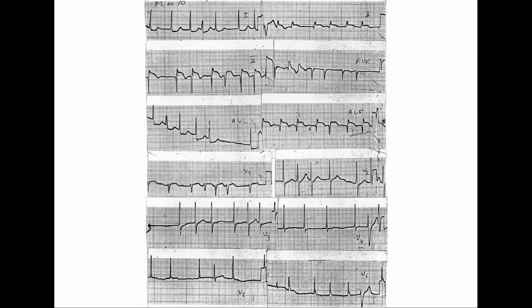Next is the QRS. Is it narrow or wide? They look narrow. Okay, very good. What about the axis? You can come here because we are in the QRS complex. It's maybe difficult to see, but this is lead 1, 2, 3, aVR, aVL, aVF. Which is the equiphasic one? I think aVF would be equiphasic. Very good. So because of that, it's going to be 0 degrees.